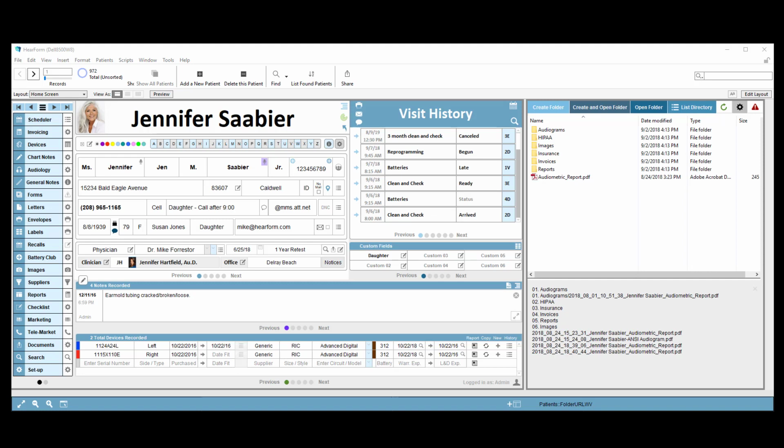We call this the overview or home screen because it is designed to give you a lot of information in one area. Now that information can be overwhelming at first, and part of the goal of this video and subsequent videos is to explain how and what this home screen means and what it does. So I'm going to look at a variety of different sections here with you, and again in subsequent videos we'll deal with all of these different details by breaking them down into shorter segments.